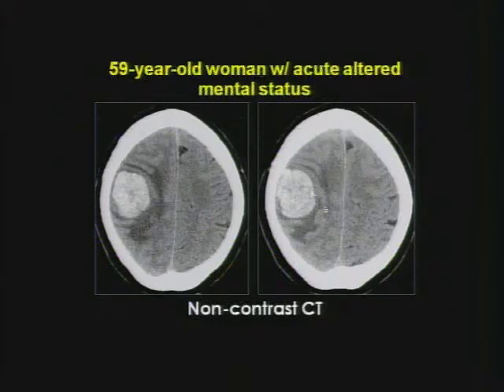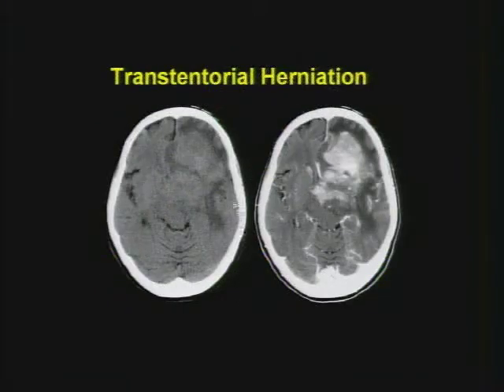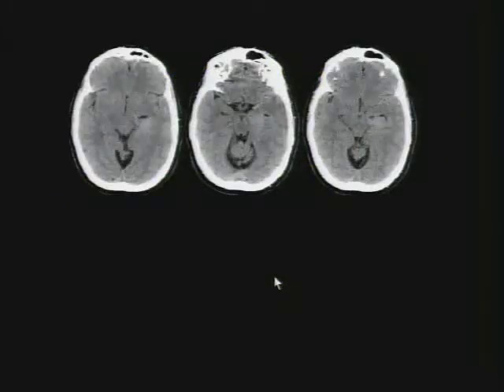There'll be a whole host of other causes, but it is very important to let your referring clinician know that there is a hemorrhagic mass, so that they, for example, this patient may have been on anticoagulation or whatnot, could alter their clinical management. This is a child with obstructive hydrocephalus, and here's that patient who is herniating with a large intraparenchymal lymphoma. This slide, I think, brings home the point that CT should not be your gold standard to image brain tumor.